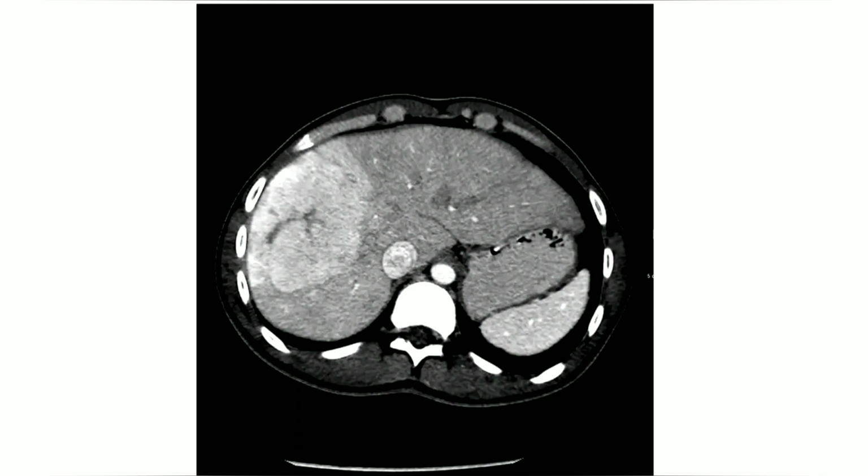First thing, any liver lesion, first word would be background parenchyma. What do you think of the liver? Always, first, is the liver cirrhotic or not cirrhotic? Fatty or not fatty? So this is your first word to me. This is a contrast enhanced CT scan of the abdomen at the level of the liver. The background liver is not cirrhotic and not fatty, right?